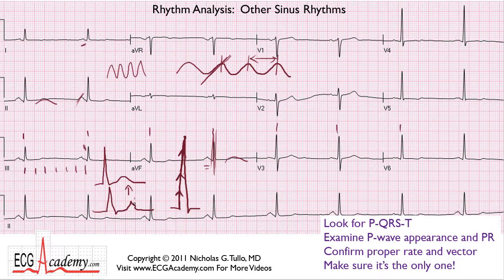A little bump, or a sharp spike, or sometimes the T wave will look like it has a bite taken out of it. That high frequency, sharp, spiky part of the signal very well may be a P wave buried in there. So when I see heart rates below 50, I always ask, could there be another P wave hidden in there?